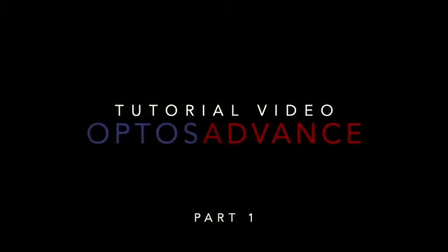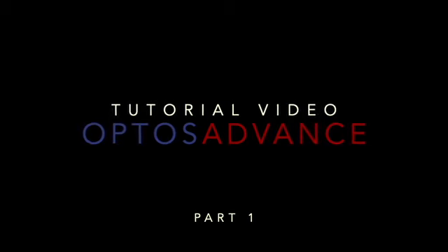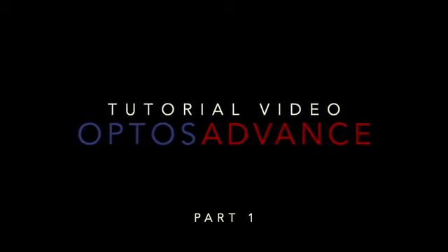This video is intended to provide information on how to use OptosAdvance to review images captured with our ultra-wide-field devices. The software is browser-based and may be used on any platform or device. To launch OptosAdvance, enter the following URL into your browser: http://OptosAdvance. This may vary with an alternative address provided at the time of installation.